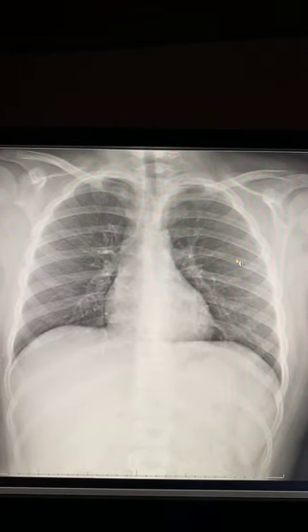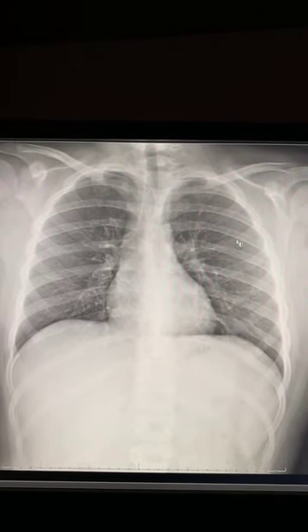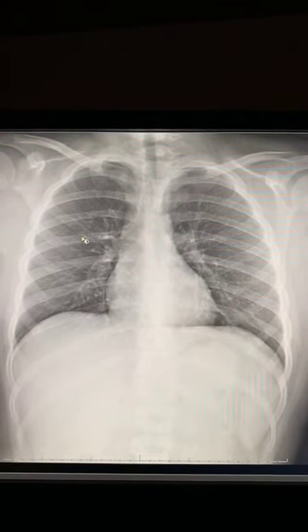Do you see the scapular border right here? That's one. There's another one right there. First of all, know that this is the scapula, right? Because this can commonly be confused for a pneumothorax. This is not a pneumothorax. This is the scapula. So if you see a lot of the scapula, it's probably an AP view.